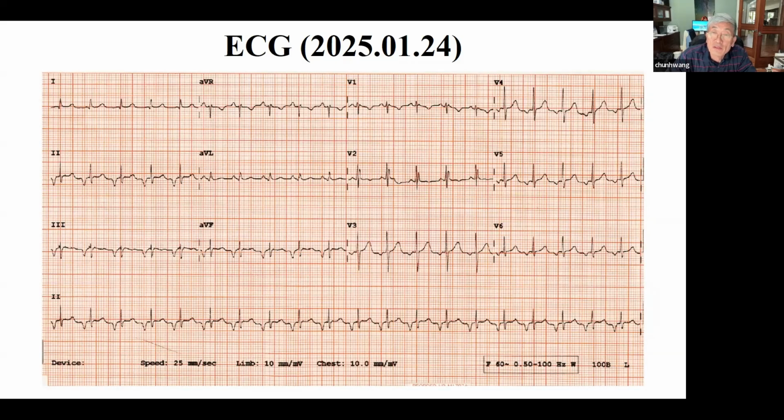That may also explain why you got a deep S wave in V6, V5, and V4. It's not normal to have a deep S wave in V4, V5, V6, right? So this ventricle is also not activating normally. Summarizing, you have a P wave morphology coming from what looks like the left side, probably the posterolateral area, and then the QRS has an underlying incomplete right bundle branch block morphology with a left superior axis.